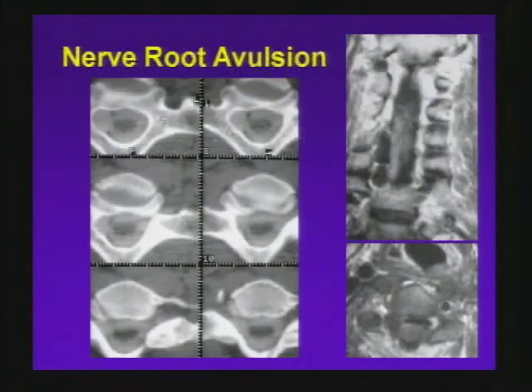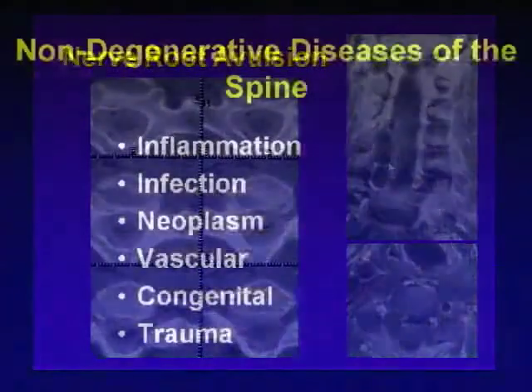This is nerve root avulsion. You can see here how the spinal nerves on this myelogram have literally pulled off, and CSF on the myelogram is leaking out into the epidural space. And you see all these expanded epidural spaces. It's like a brachial plexus injury, only more medial.